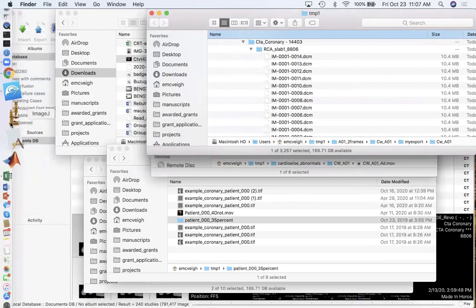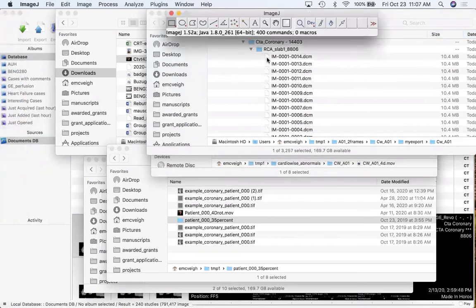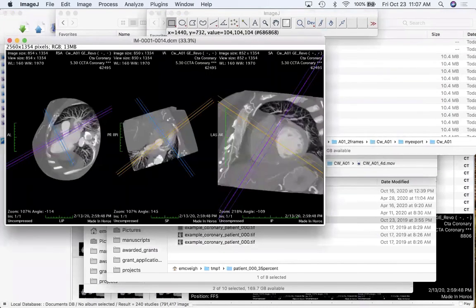I think you can then, let's see if this is true. If I go to ImageJ, which is another free program, and you want to analyze one of these DICOMs, I believe we can just copy it into, yeah, you just copy it into ImageJ and then use that program to do subsequent analysis, right? So, you know, you have the pixel values here. Again, looks like it's 8-bit color data, right, is what has been saved. You have 3 numbers up here, 196, 196, 196, which is the gray value of this. And then what does it encode the background as is 10.